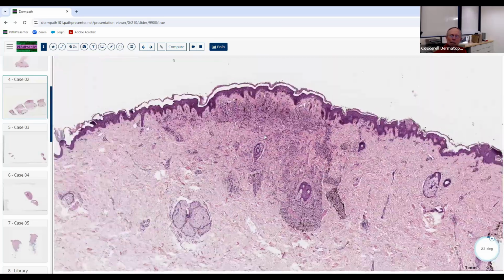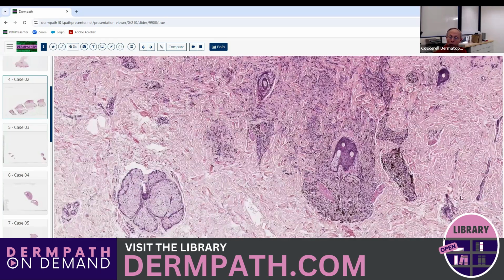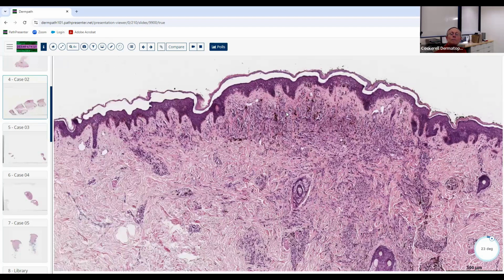And so what's the pattern of this? You did notice this deep vertical orientation, which is important to see. We'll talk about that in a minute. But what about the other overall pattern of this? Forget this part for a moment. Let's just look at this pattern here.